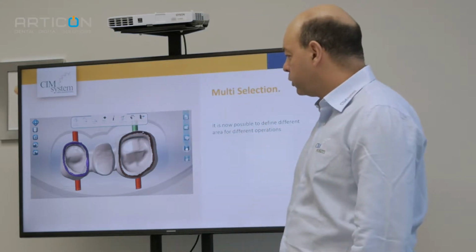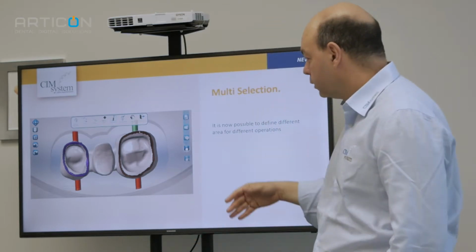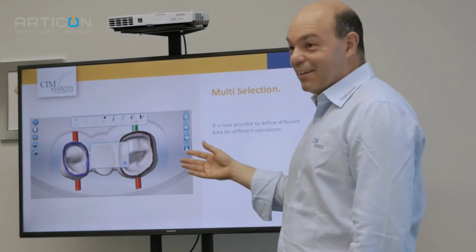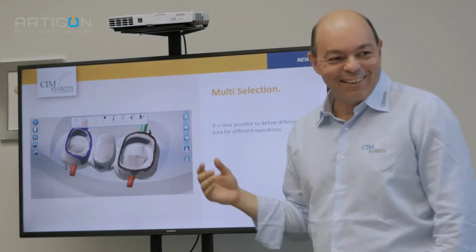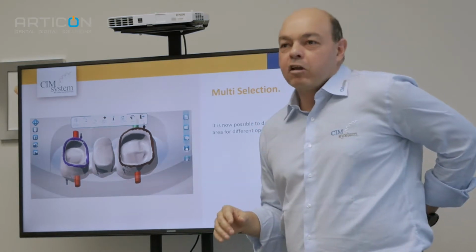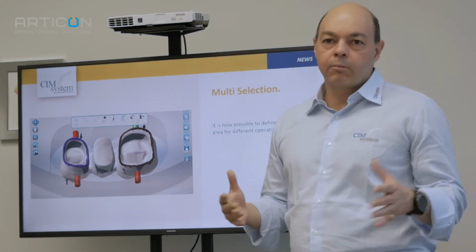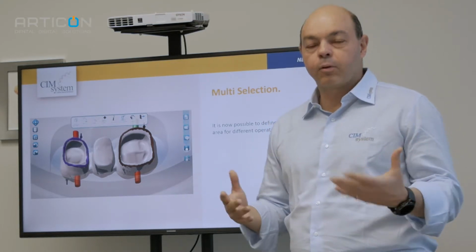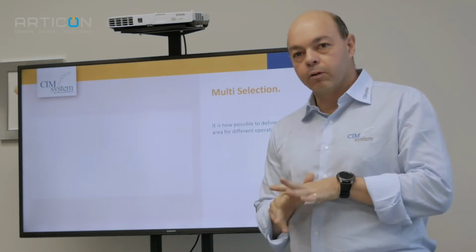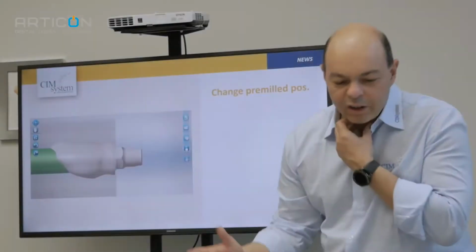It's three different operations. Yellow, see, violet, yellow. These strategies, are they pre-installed in Millbox, or do we need to have them? Yeah, I made them in the last strategy. I made some operations, but it's possible to add operations in the Millbox. I needed to create this special operation. Okay, this is easy.